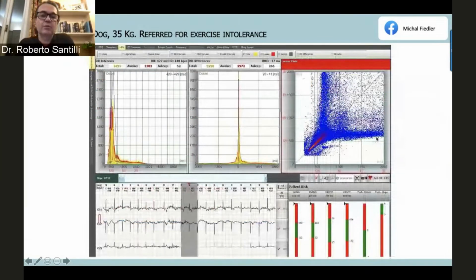So what's the treatment for this functional AV block? We had cases where the sinus arrest is very prolonged together with the AV block and without escape. In this case, it's not symptomatic because you do have a lot of escape, as you can see here in red. But in case you don't have enough escape and you have syncopal episodes, I think you need to put in a pacemaker, and it's usually well responding.